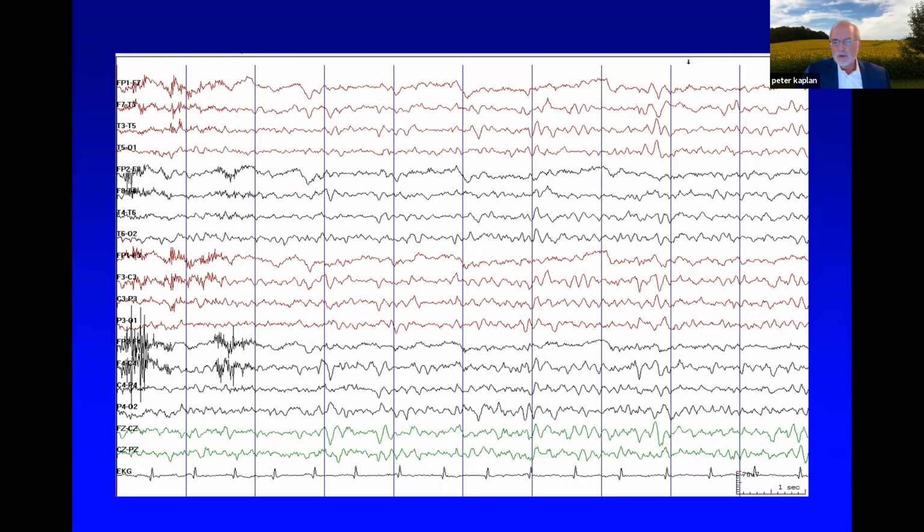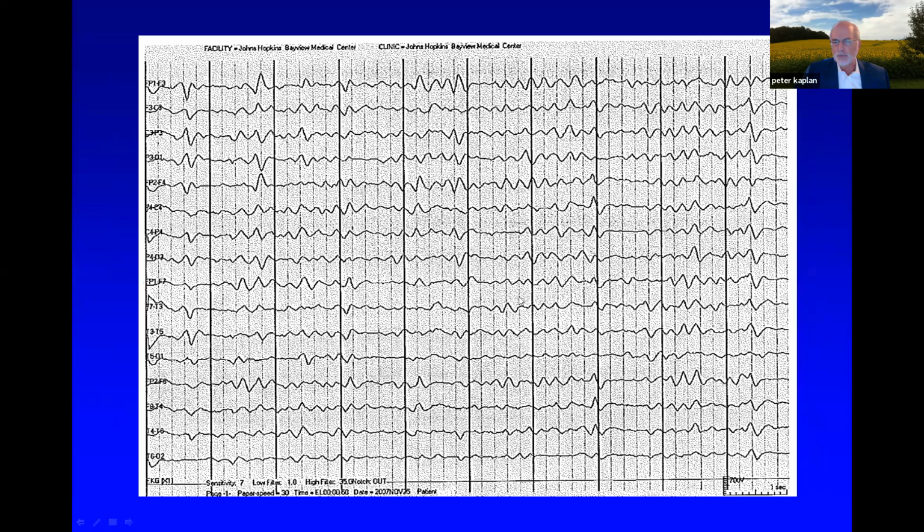Now, here you're beginning to see some changes, and you have a broken up posterior basic rhythm. There are more slower frequencies intruding in here, and this would be more theta with some alpha and correspond to a grade 2. This is a more pervasive, diffuse 5 hertz pattern, in other words, diffuse theta.